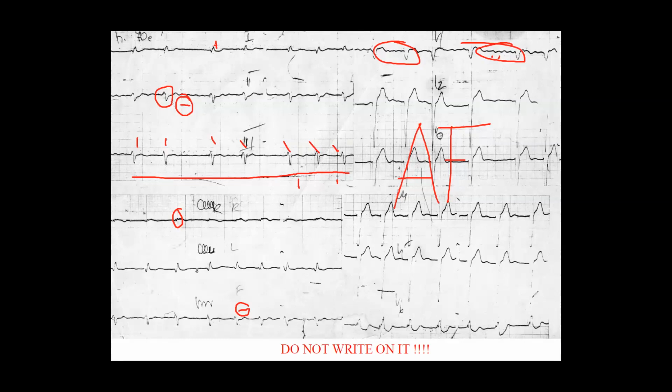Is it always that, if I don't see a P wave, I assume atrial fibrillation? Yes, but it needs to be arrhythmic. For it to be atrial fibrillation with no P wave, it has to be arrhythmic, exactly. Okay, go on.